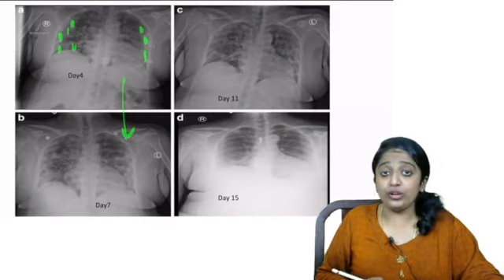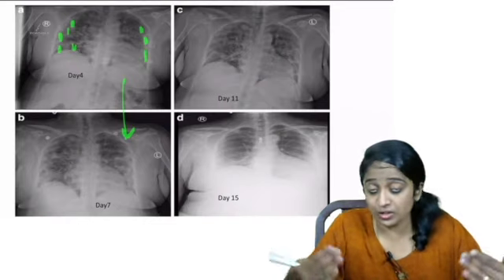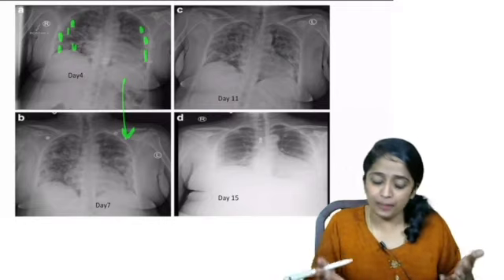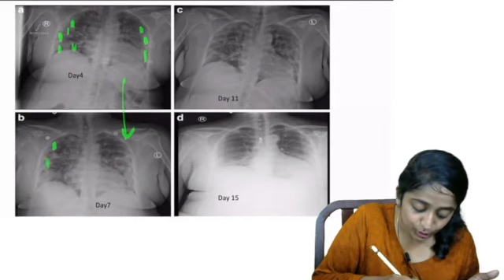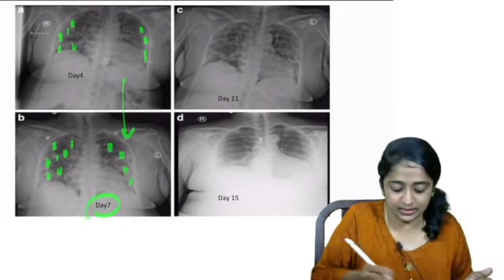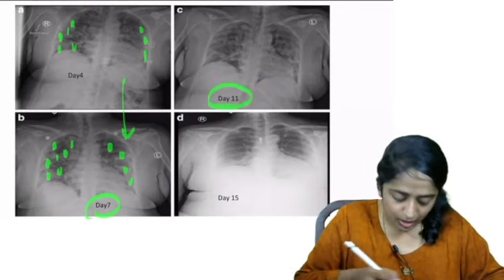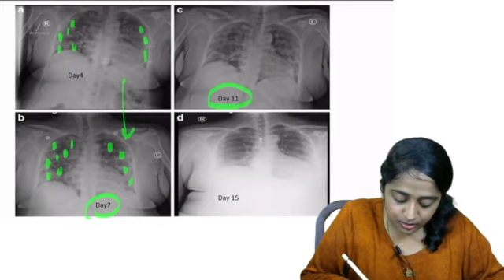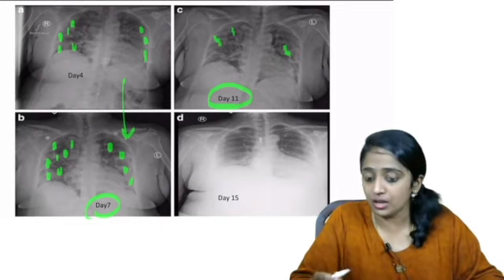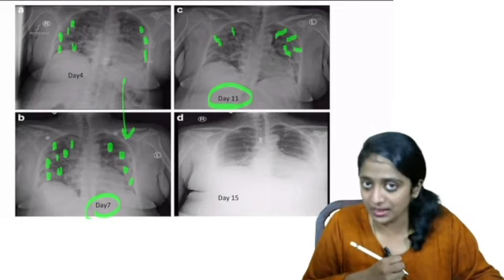On day 7, a radiograph was repeated because the patient's breathlessness was worsening. So, just reflecting the clinical manifestation, what can you see? You can see more and more opacities in the radiograph by day 7. Now, a repeat radiograph on day 11, what is seen? As compared to day 7, there is mild clearing of opacity. But what additional features have come? You're seeing slight new reticular shadows, linear opacities.